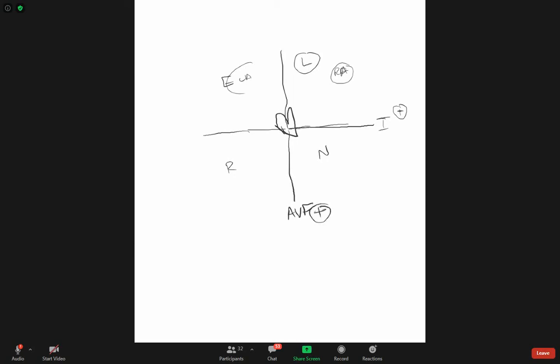Okay. So what does positive mean? When you look at the ECG in lead 1, you have a positive deflection of the P wave. Then, for example, you have this ECG with Q, R, a little S. Let's say this is the ECG, and here there are 5 small squares, and here 1, 2, so this is mainly +3, so it's considered positive.